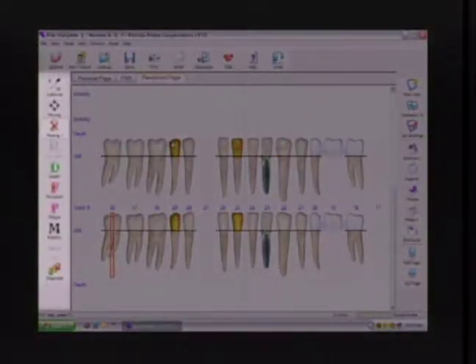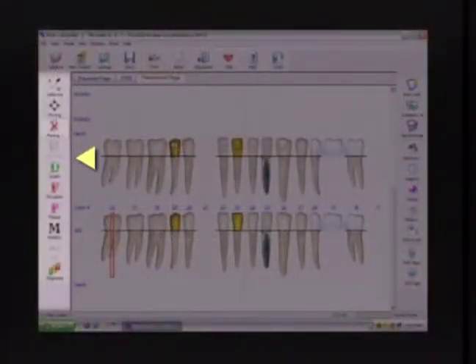Now look at our mode menu here on the left-hand side. Remember, we're in the missing teeth mode now. It's highlighted. We had recession turned off in those initial visit settings. It's grayed out. We're going to skip it, and it's going to automatically move into the next mode that's selected, which in this case is pocket depth.